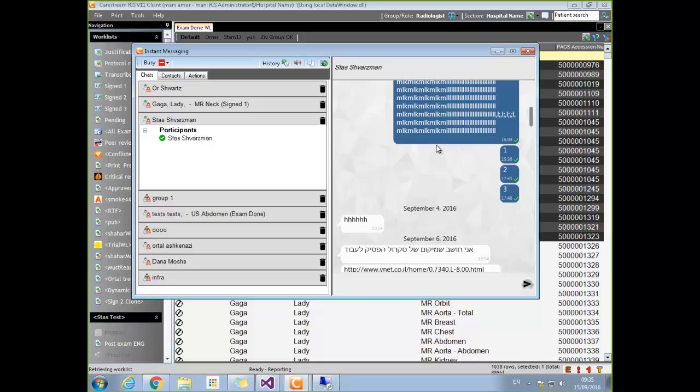Critical results. If the referring physician has access to RIS, maybe use it to notify about critical results. In that scenario, you are using chat also as a notification tool, because the other system has notifications, but not really things that trigger when you log in. So the RIS is a user that wants to chat with you. Exactly, it's the system user.